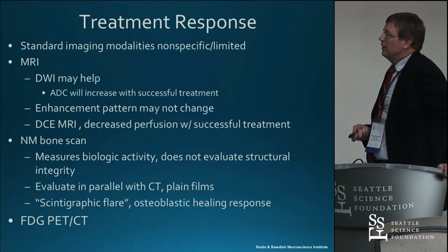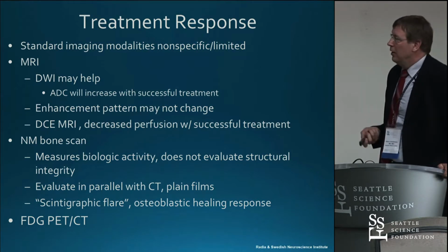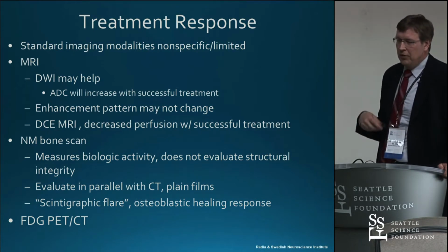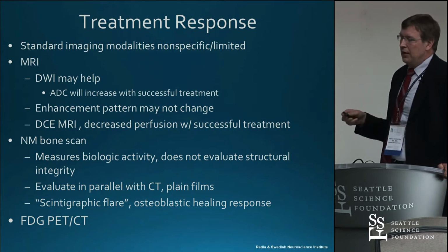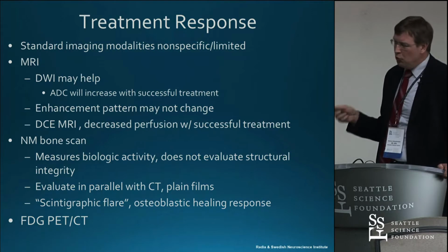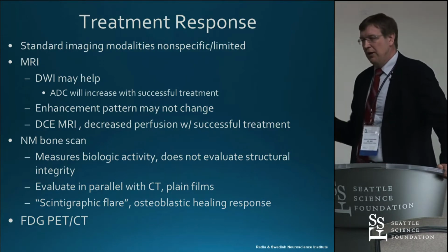Some advanced MRI modalities that can be used are diffusion, DWI, that we use in the brain, for example, to see stroke. It can also be used here because it also finds tumor cellularity. So if there is treatment response, the cellularity decreases.